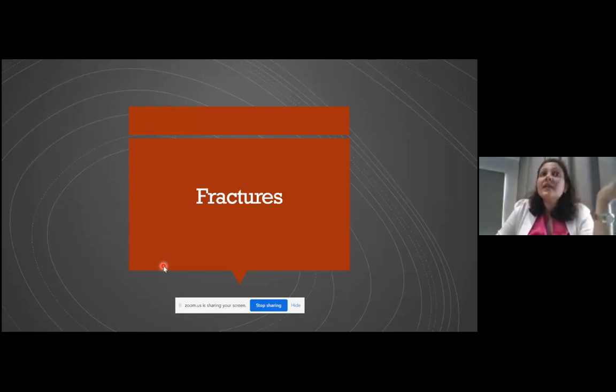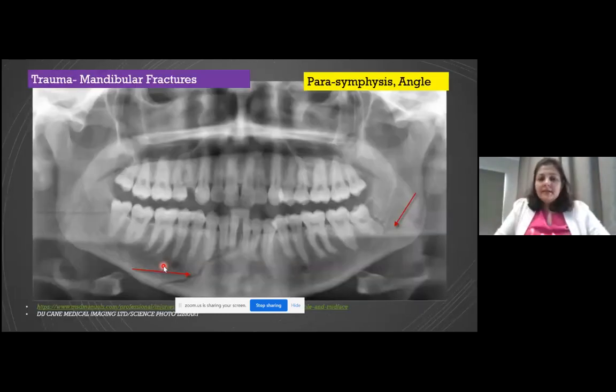But for other cases, which are common motorbike accidents, one of the commonest is where the patient falls forward and hurts the chin, because of which there are fractures. That's why it's very important to tell your patients to wear a full helmet which covers even the jaw. Now, these are some areas of fractures which you can see already pointed out by the arrow.